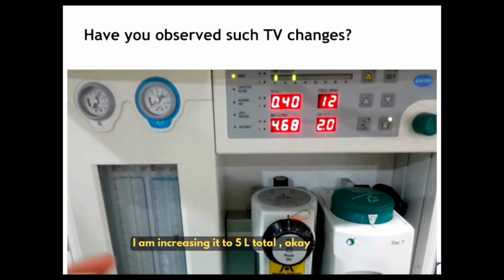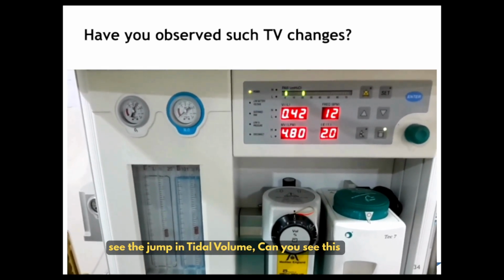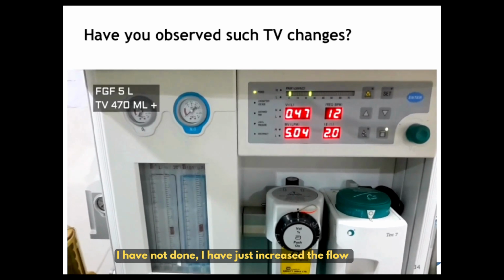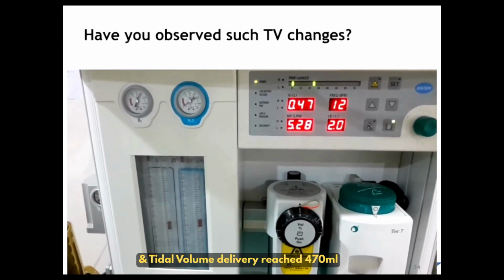I'm increasing it to 5 liters total. See the jump in tidal volume. Can you see this? I have not done anything there. I have just increased the flow, and the tidal volume delivery has reached 470 ml.